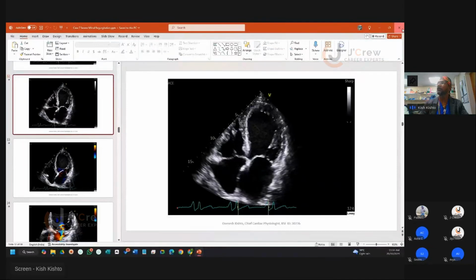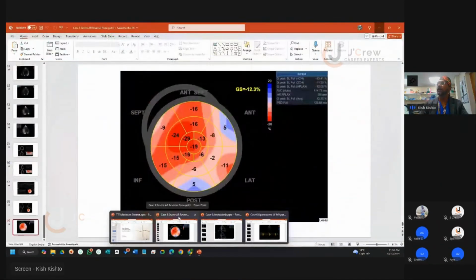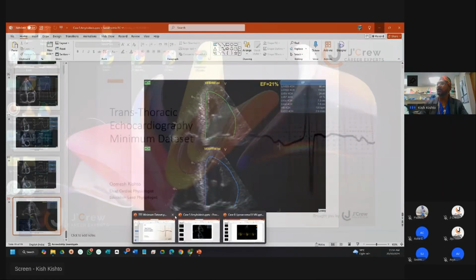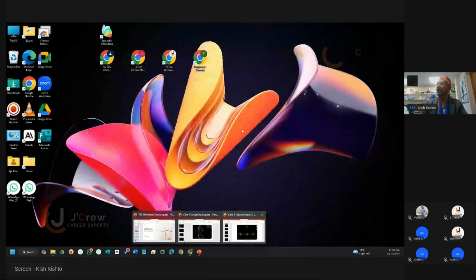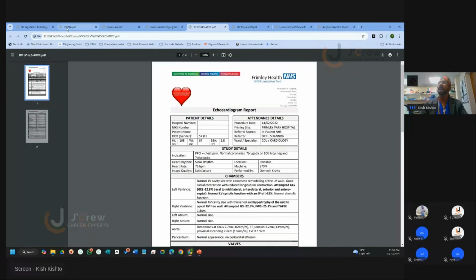Okay, let's close this because that's done. And severe AR, just done that. Let's get rid of it. Have a look at this in a sec. So we've done normal pathology, AS, AR, done.